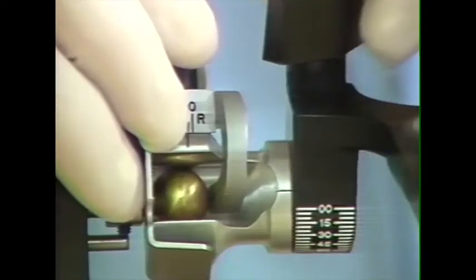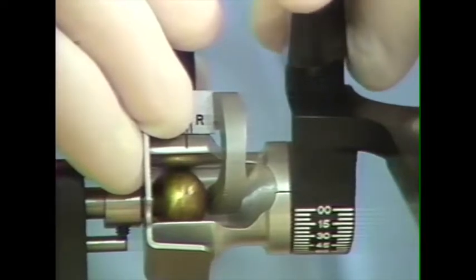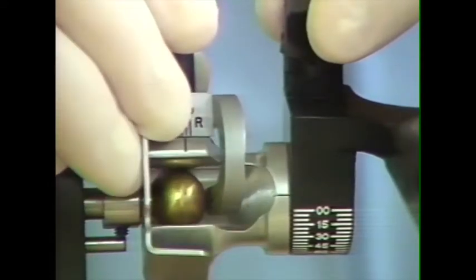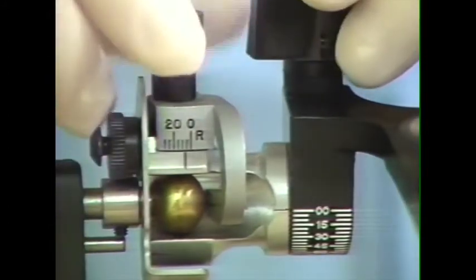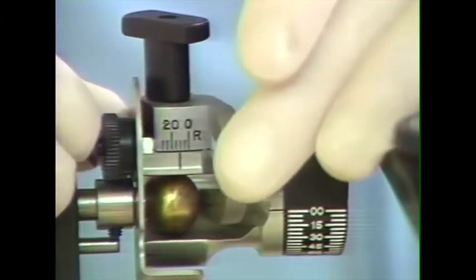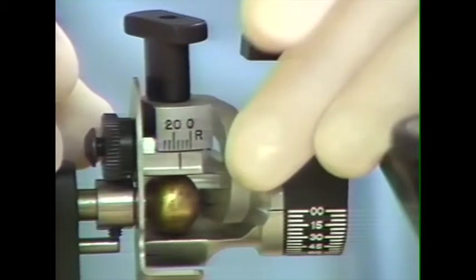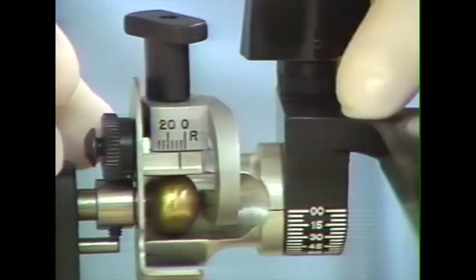The modular articulator has adjustable condylar elements. The condylar inclination can be set by loosening this set screw, the knob on the top, and raising and lowering the inclination to accept the record. It also has an adjustable Bennett angle, which is adjusted by loosening the other large set screw and moving the inner curving of the condylar element inward and outward according to the record that's placed into the articulator.